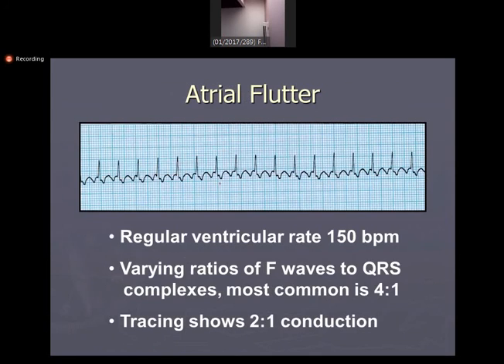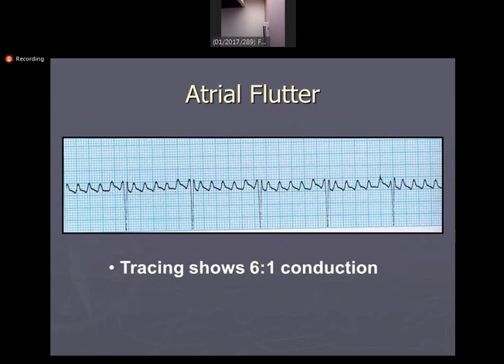It is an atrial flutter. Atrial fibrillation. What is atrial flutter? It is a focus in the atria which generates current multiple times. But some of the atrial current goes into the ventricle and depolarizes the ventricle.